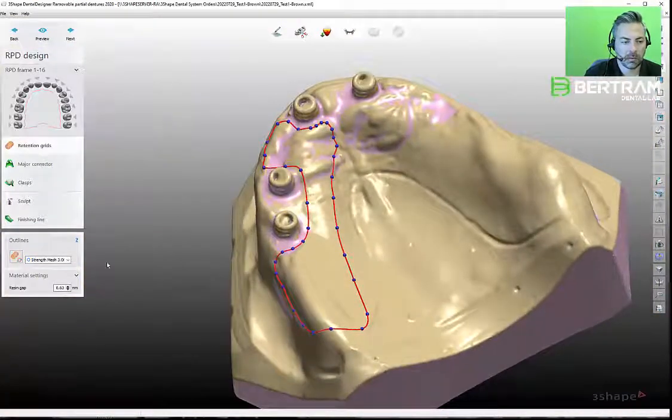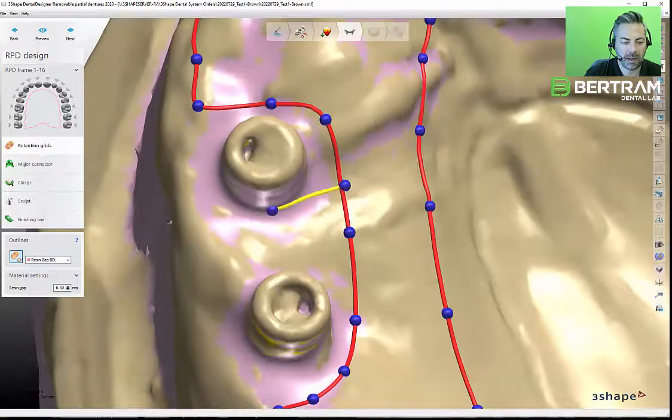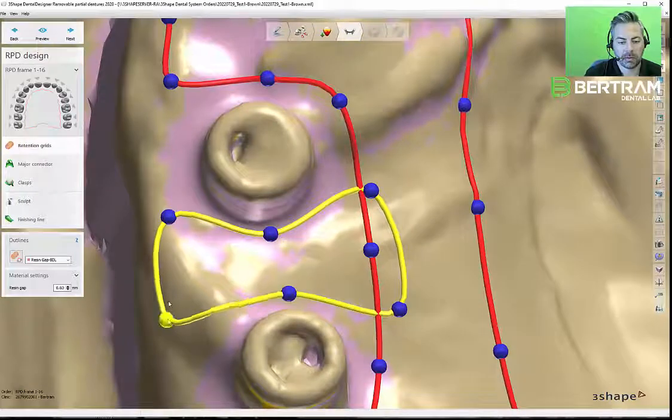Okay, so what I'm going to do is I'm going to select resin gap. So really what I'm just laying down is like sheet relief. I'm matching this 0.6, I'm matching that gap height to what this mesh will be. And I'm just throwing a little piece in here, and it'll make sense later why. So we'll lay that down.